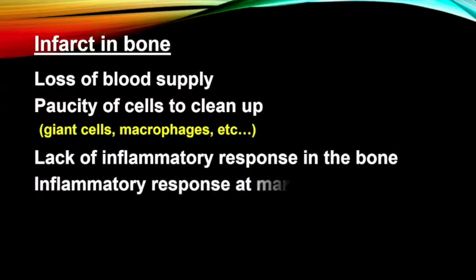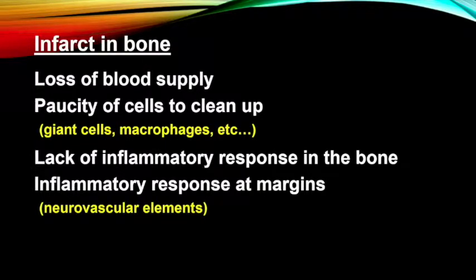So sometimes there's a lack of inflammatory response, and I'll show you where I think that ends up. Sometimes the inflammation is at the margins where the neurovascular elements are, and it can be painful or not. Now this woman, I get phoned up by the tech, I want to read on my scan because he ordered it. He saw 1 on the panoramic. When he ordered the scan, he said he saw 4, and I don't have any symptoms. I'm totally pain-free. I'll show you her image in a minute, she had a little bit of calculus and some periodontal inflammatory change at her gingiva. She had no other signs or symptoms, okay?